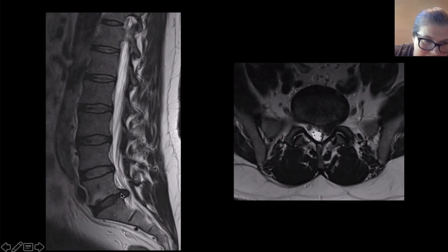So the base, sorry, I guess I'm saying base, but it's the contact with the parent disc. So if you look at the contact with the parent disc, it's right here. And if you look further out in the disc, it's wider. I agree on the axial, it looks like a protrusion. It's definitely wider at the base than it is here.